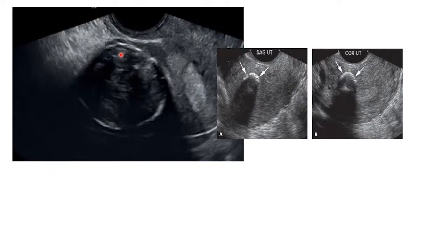gynecological ultrasound examinations. So how then do you differentiate a fibroid from the head of a fetus? One, the history of the patient, the pregnancy test. At the same time, you can't have a head without other fetal parts. So this is an isolated mass presenting in the uterus, but there are no other parts to confirm that it's a fetus. So this is a fibroid with a calcified rim. You see the rim is calcified, and then you can see the endometrial cavity there.